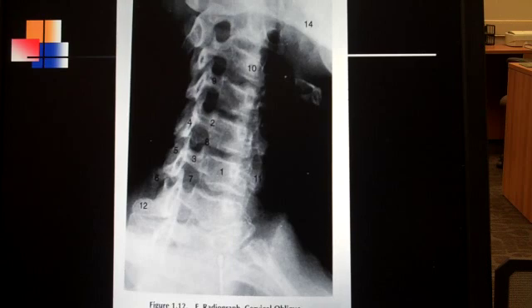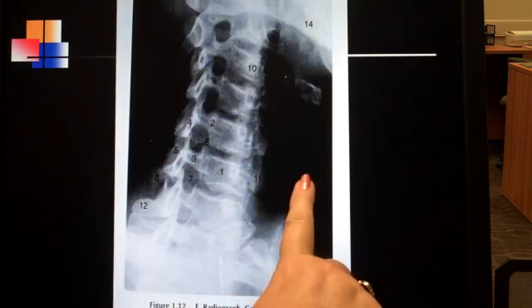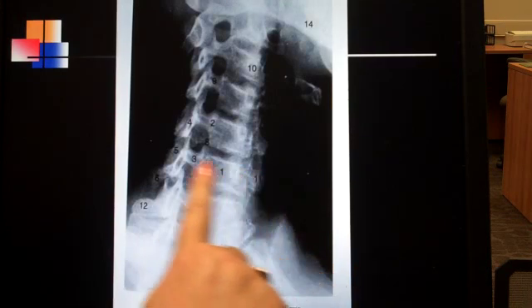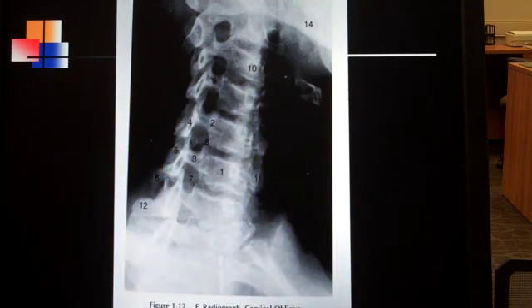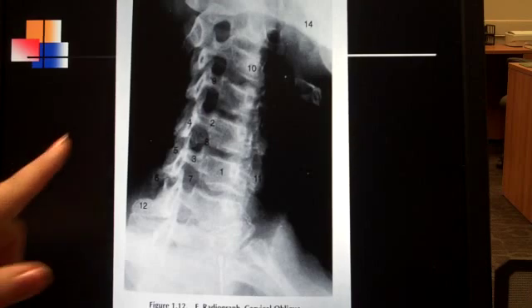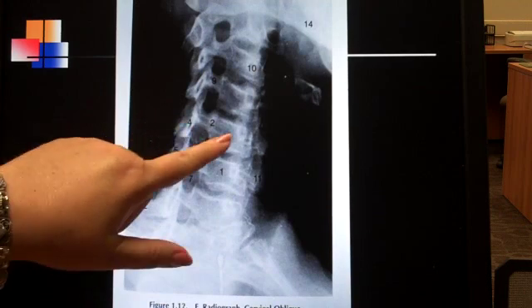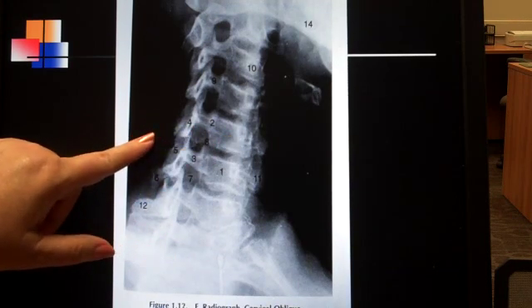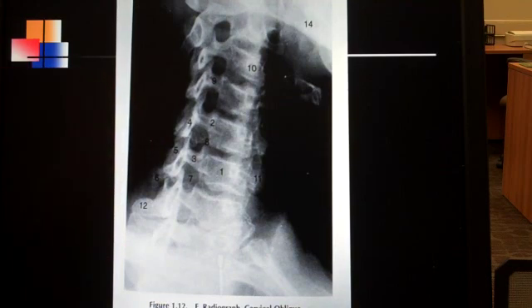have a right posterior. How would we know which one is which? It is by the location of the marker and what it is closer to. If you had a right marker right here on this side, closer to this vertebral body than it is to the spinous process, then that would tell you that that is a right posterior oblique. However, if you had a left marker right here on this side, closer to the spinous than it is to this vertebral body, that would tell me that I have a left anterior oblique. On either of those two views, you are looking at the left IVF.